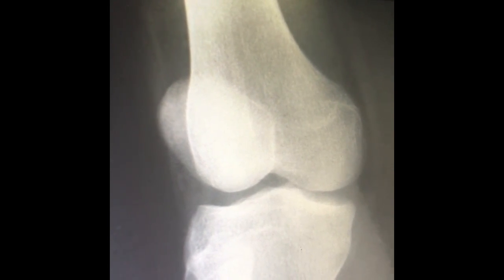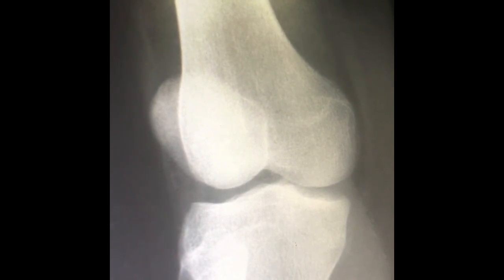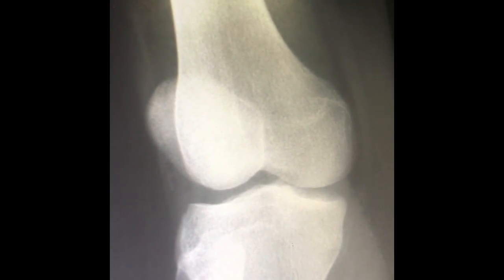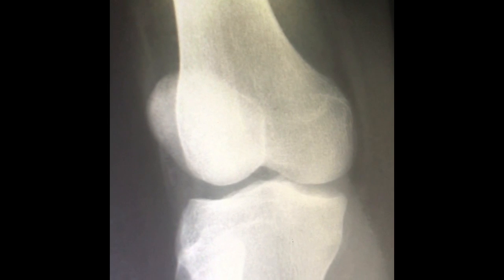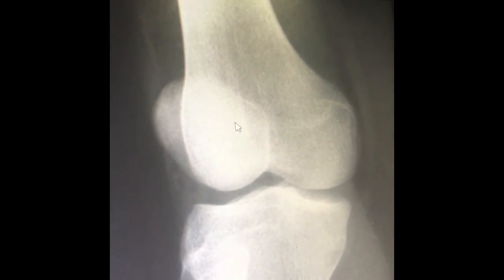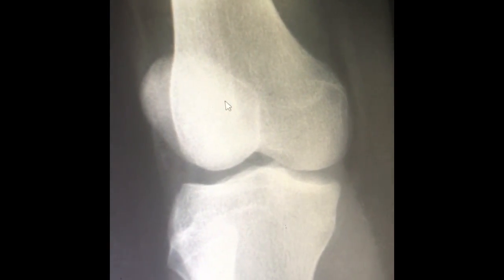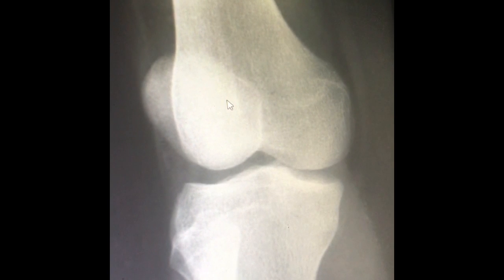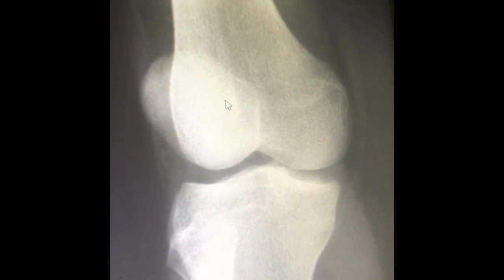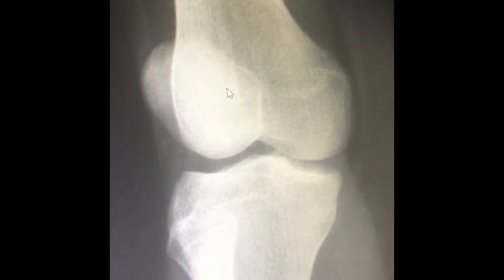So we're just making sure we have superimposition. And then margin of the patella projecting slightly beyond the edge of the lateral femoral condyle. So we want patella towards the lateral side here. And once again, open knee joint, soft tissue, and bony trabecular detail. And ballpark range for this image would stay the same as the other knee images that I've gone over, 85/5, reasoning being the use of a table bucky.